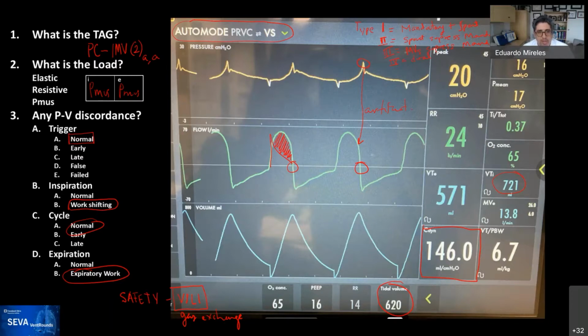He was working against the ventilator and whatnot. So we said, okay, let's put him on volume support. He was on PRVC with the same settings. He's a fairly large individual, as you can probably see by the tidal volume that he's set at. And then we turned off the sedation for his spontaneous awakening trial, and this was the result of that.